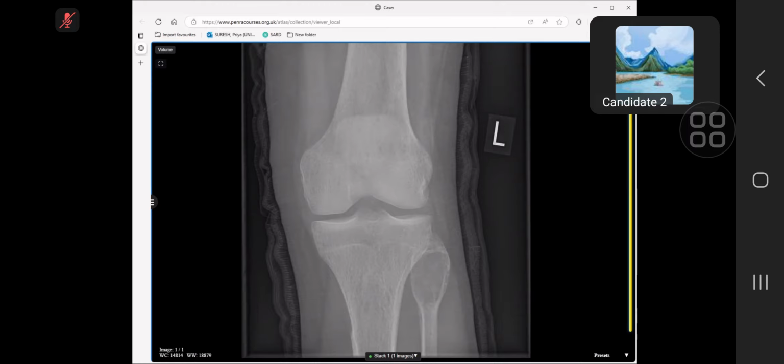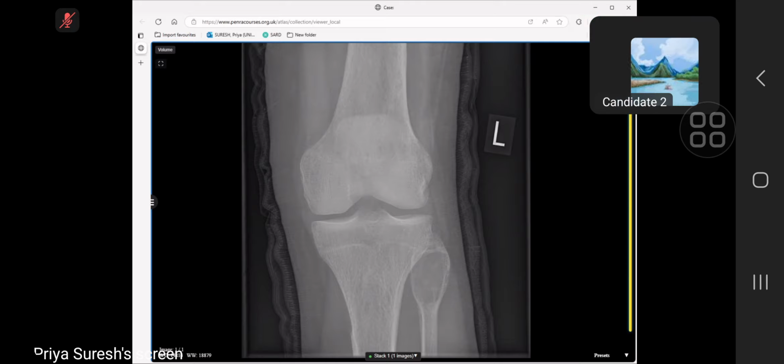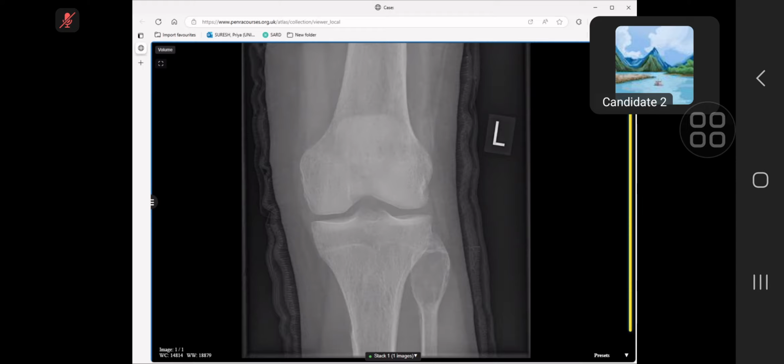So I would like to know if there is any past radiograph available. I would also like to see it on any other view. Plus, the distal part of the femur is showing some degenerative changes, maybe due to disuse atrophy. This is a skeleton that has just fused, but there are quite significant degenerative changes on the femoral side of this joint.